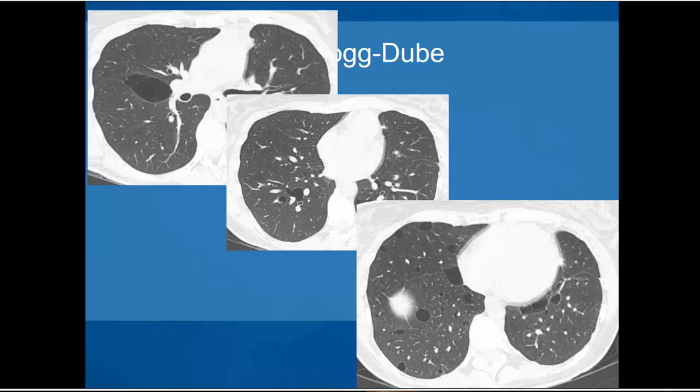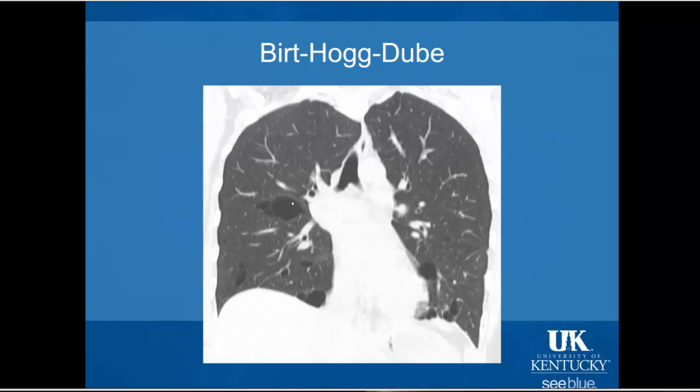But in this case, they're lower lung predominant, and we see them in this elongated form, and we see them occur more along the mediastinum and more along the pleura. So that helps distinguish them from pulmonary cysts found in LAM. Again, highlighting that subpleural positioning of some of these elongated cysts, and cysts occurring along the mediastinum, lower lung predominant in the craniocaudal plane compared to more diffuse lung cysts in LAM.